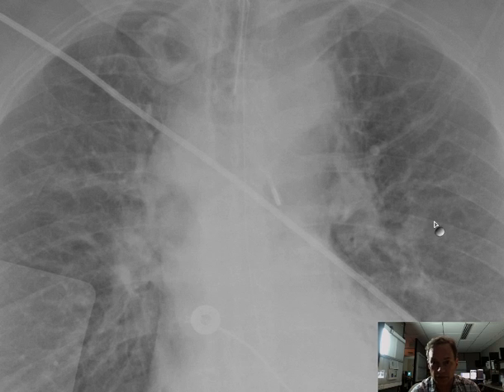Now I hope you can see this, but some of the lines here are prominent and some of these are vascular, and it's experience that will help you learn what's vascular and what's not. But the fact that they taper a little bit suggests that all of this busyness in the hilar regions is congested pulmonary vasculature, probably pulmonary veins, because the return is impeded by heart failure.